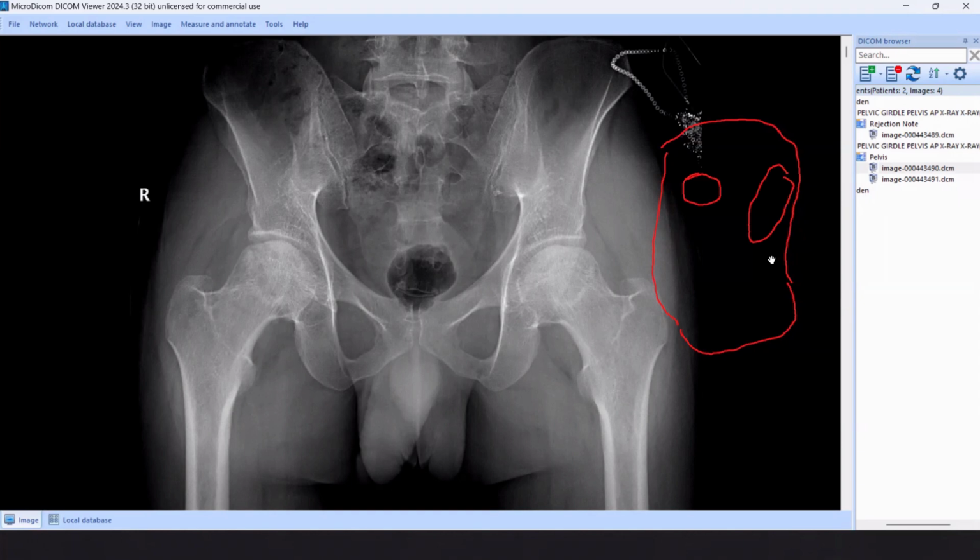If we have pancreatic calcifications, this one can be secondary to chronic alcohol drinking for a long period. So this one can cause chronic pancreatitis and at the same time avascular necrosis of the femoral head. Also, the H-shaped vertebrae is pathognomonic for sickle cell anemia. Also, the sacroiliac joint. It's very important to comment on the sacroiliac joint here. If you find any sacroiliitis, this one can raise suspicion for ankylosing spondylitis or something like idiopathic sacroiliitis that can explain that the patient received long-term corticosteroids or endogenous corticosteroids.